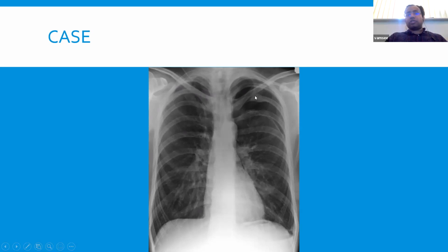And when you follow the cortical margin along here, you can clearly see a step going along there. So what this person probably has is a simple traumatic pneumothorax. And if I had to draw the margin, it would be going from roughly along there. And I hope it's projecting well enough for you guys to make out.